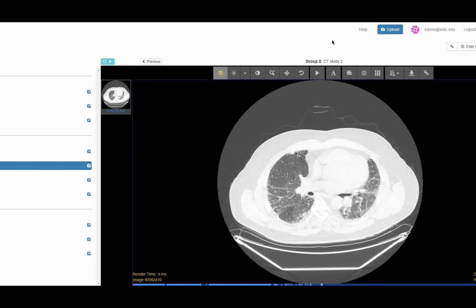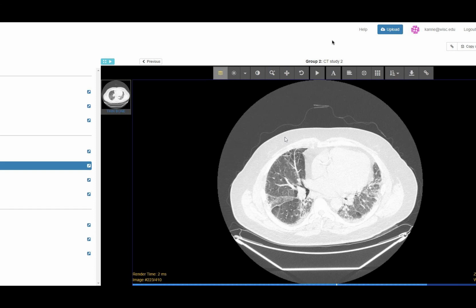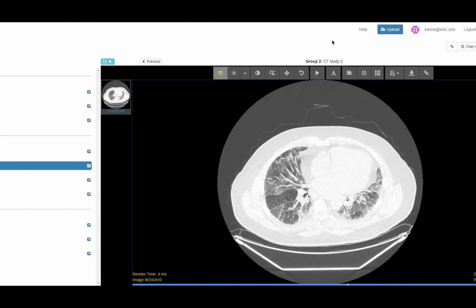So when they were referred to us with their initial imaging, we read this as favor connective tissue disease, NSIP, and then only recently have the old studies become available in the rest of the history. But it's kind of interesting, and I'm not 100% convinced this is all just sarcoid, or if this patient has two things, and that the biopsy missed the organizing pneumonia, and it was an evolving organizing lung injury, and then the patient developed sarcoid secondarily or independent of, and then went away and is left with this fibrotic NSIP.